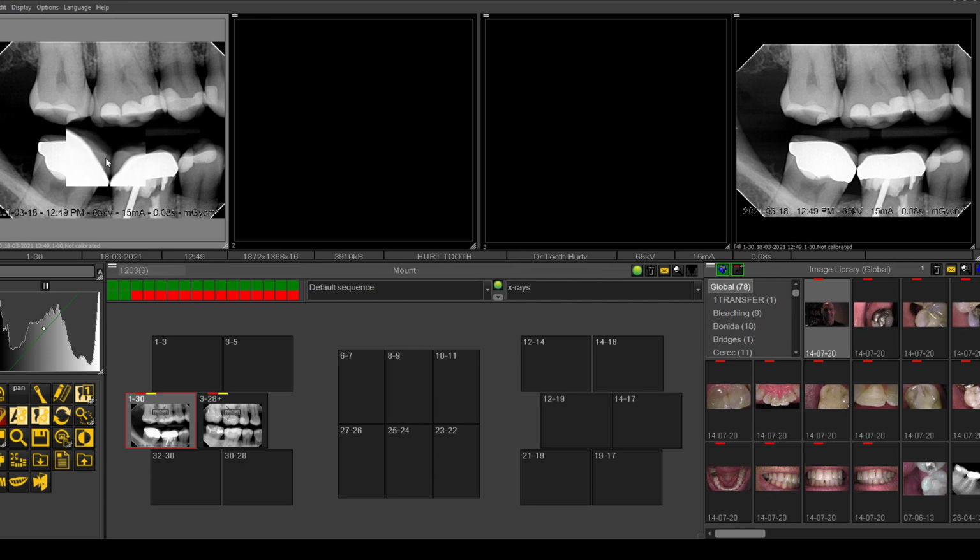On the right mouse, you can click and it will open up a magnification window. And if you continually hold it as you're moving the mouse around, that area will be magnified. If you have a mouse with a zoom wheel, you can zoom in and zoom out. So real-time zooming in and out on the image.